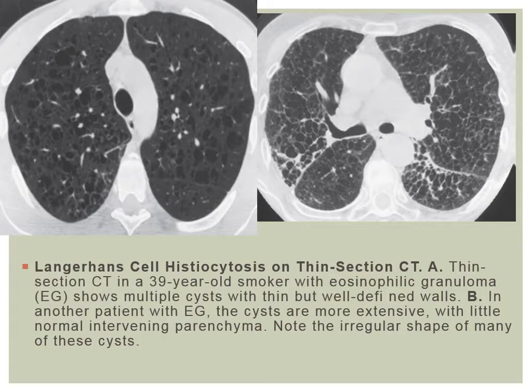you put lymphangiomyomatosis. It's a very similar appearance. If female, but male, never. It's uniform. This is not uniform. Well, they say it's not uniform, but written in the book, it's more uniform in size.